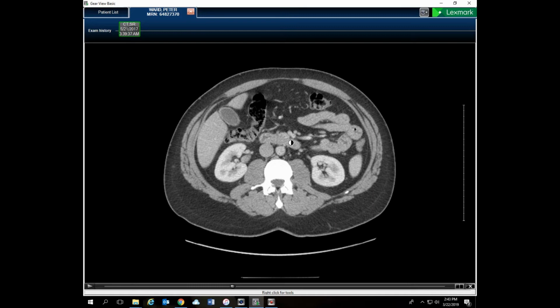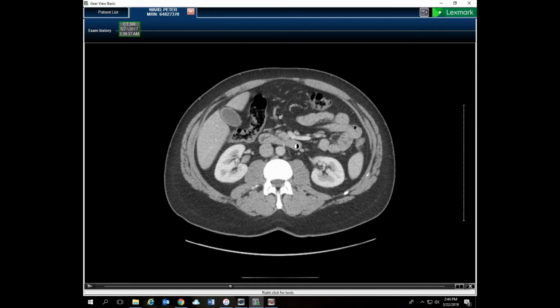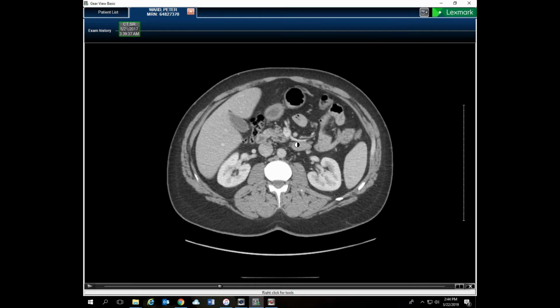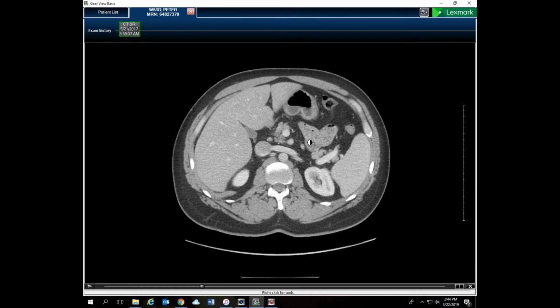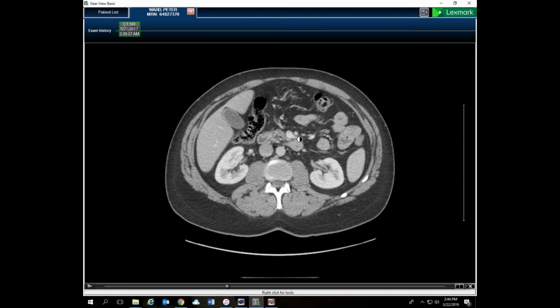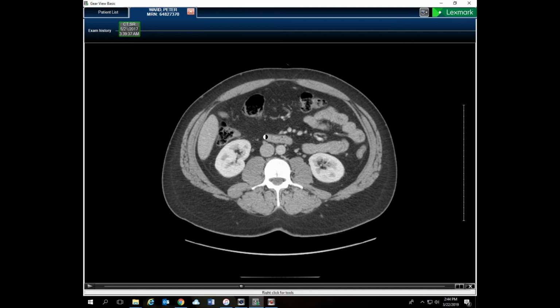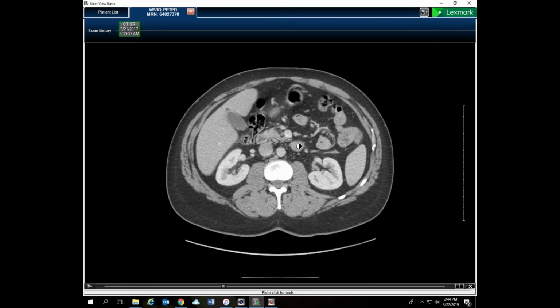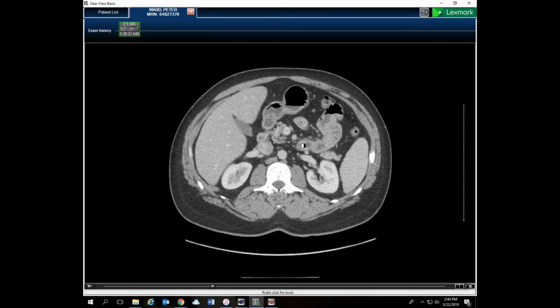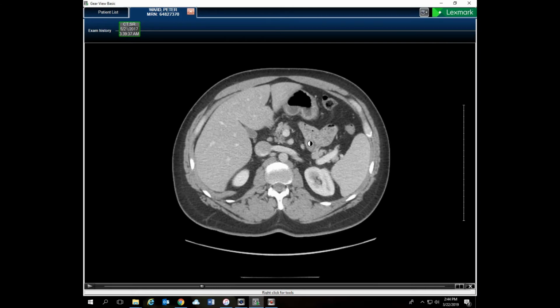here. Now at this point, the third part is going to actually ascend and become the jejunum, some of which we can see right here. So to see that happen, I've got to reverse direction and actually go superiorly and watch for this to jump into the jejunum, and that's happening right about here. So we've got, let's see, duodenum transitioning here, ascends, and as it ascends, it's going to turn into jejunum.